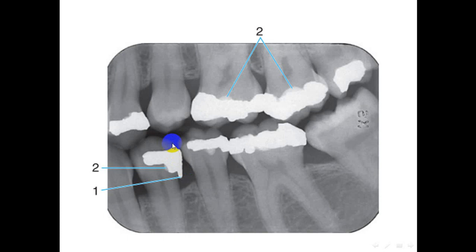So when you condense the amalgam going out of the outline of the tooth, it appears as an overhang, and this overhang is a mistake, causing more food accumulation and impairing the self-cleansing of the interproximal area. Second is the base material used under the amalgam restoration. From this and the previous radiograph, note that there are many shapes and sizes of the amalgam restoration.